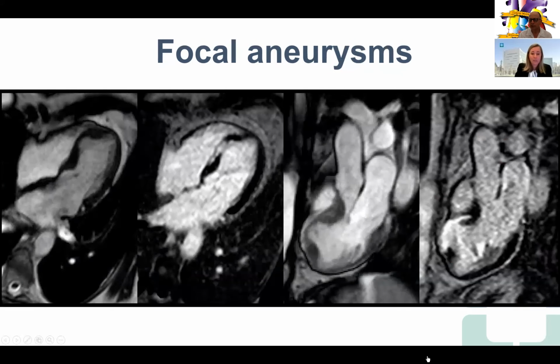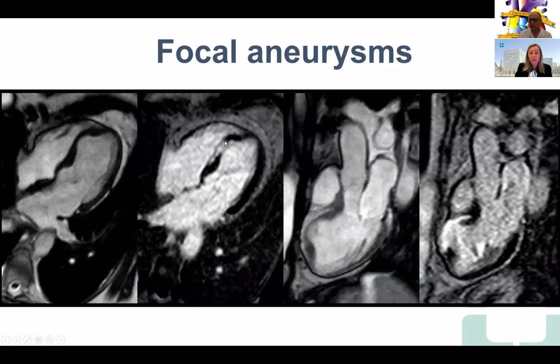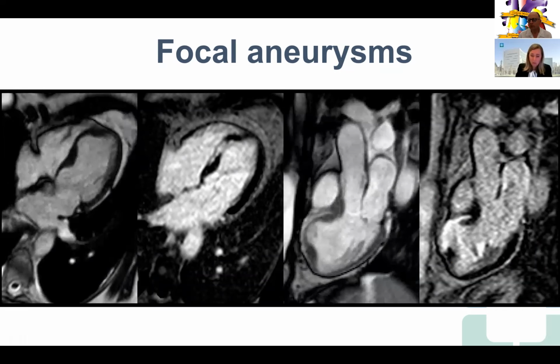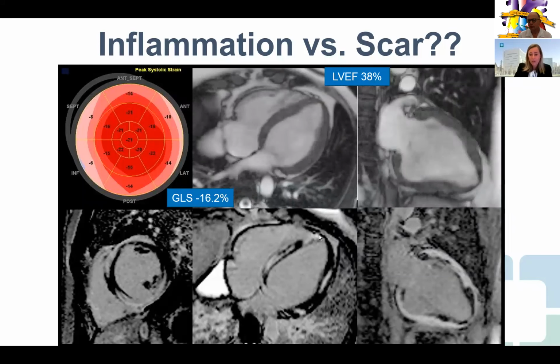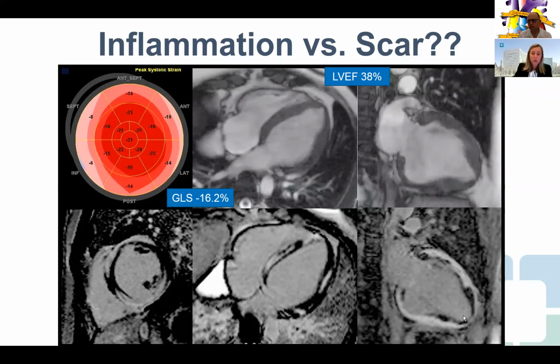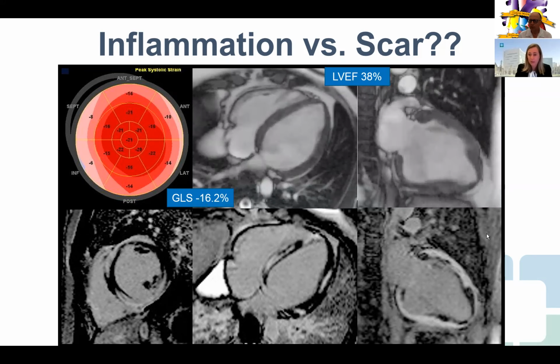And then these beautiful MRI images here where you've got similar findings on cine imaging with that focal delayed enhancement. And so these, from a multimodality perspective, are lovely illustrative cases. Another case here where you can see really that diffuse uptake, sort of focal on diffuse with the reduced strain, and then these quite lovely MRI delayed enhancement images.